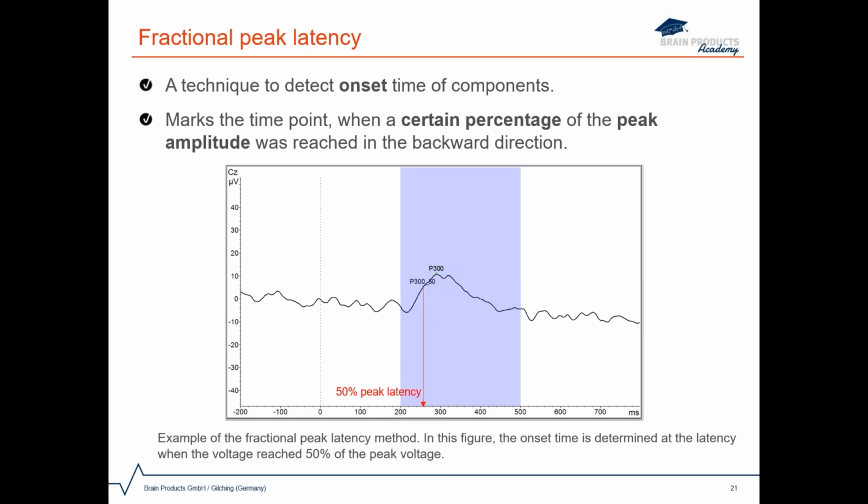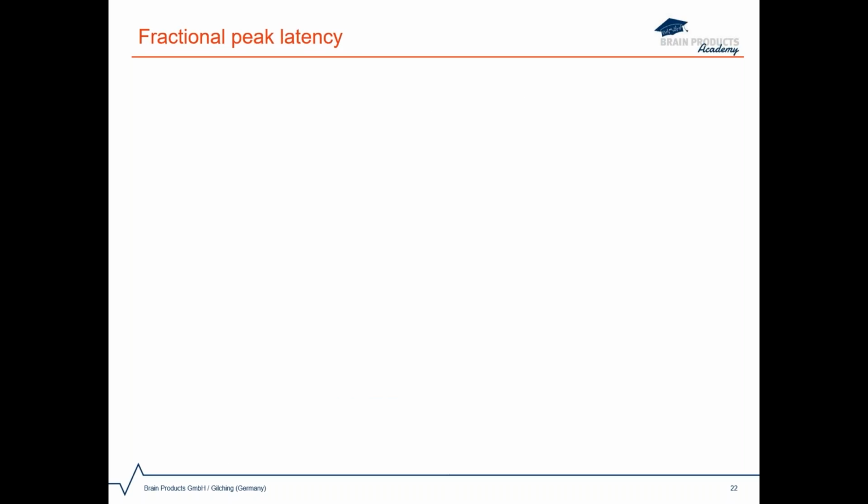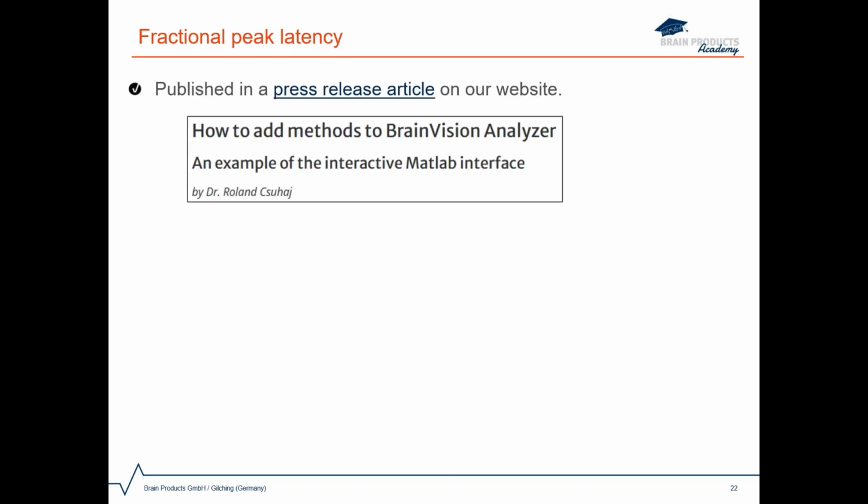Analyzer doesn't have a transformation for performing such quantification, but we can add this method in Analyzer easily with the help of Matlab transformation. In fact, we have a press release article on this method. It is published on our website. Let me show you.